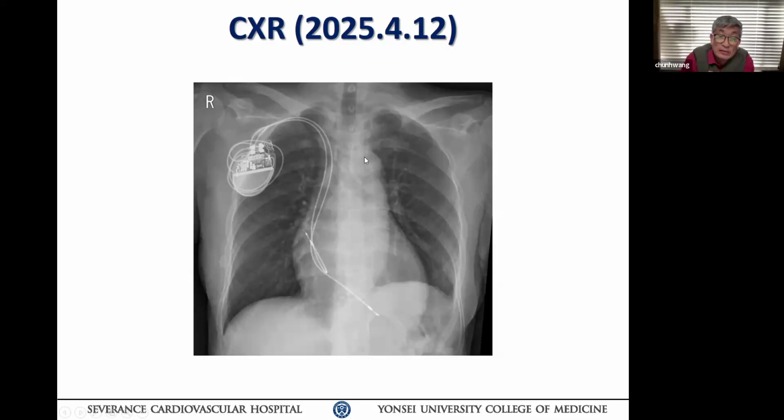So this pacemaker lead placement, as we suspected, is in the posterior wall toward the apex. That's why the EKG looks like left bundle without transition and with a superior axis. Typically you don't want to put a pacemaker lead in that area because the contraction dyssynchrony is much more severe compared to placing it in the septal area.